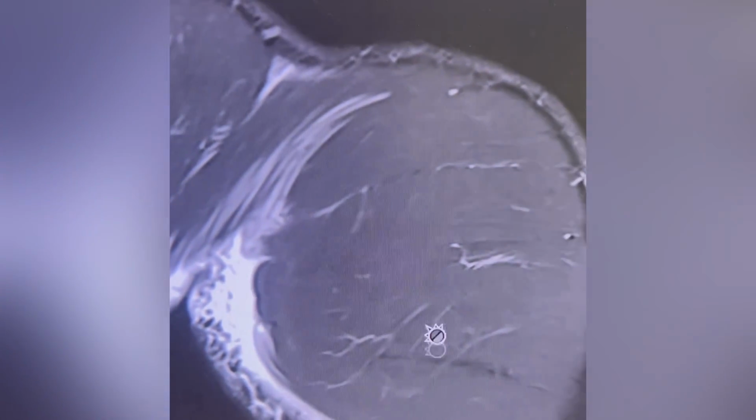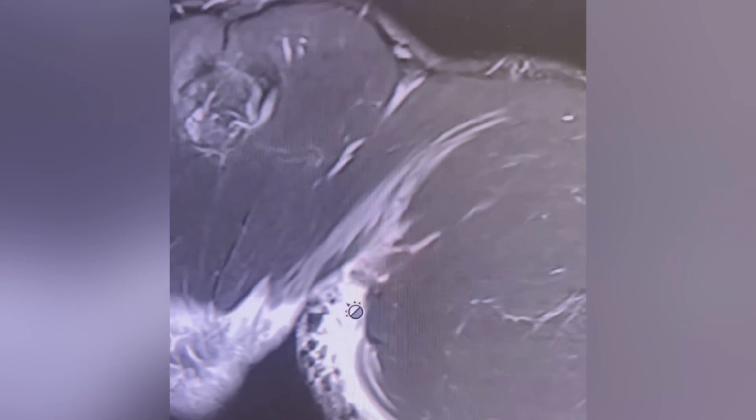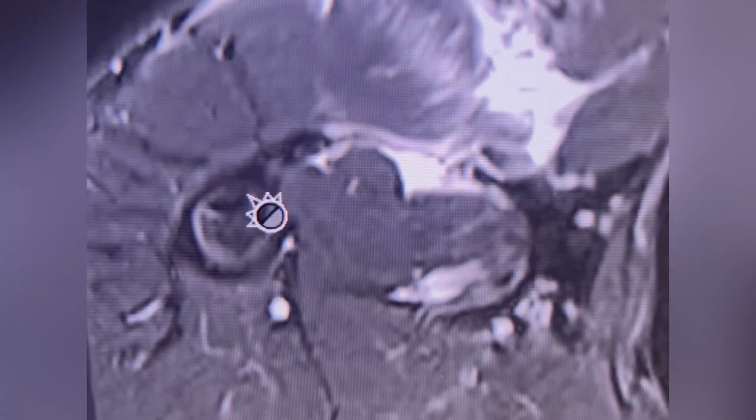This patient is very athletic. You can see lots of muscle, and there's a lot of swelling here because they just sustained a pectoralis major tendon tear. Now, the tear happened to be a muscular tear or a myotendinous tear. What does myotendinous tear mean? It means that the tear occurred right where the muscle meets the tendon. So some of the tendon is left behind on the bone.